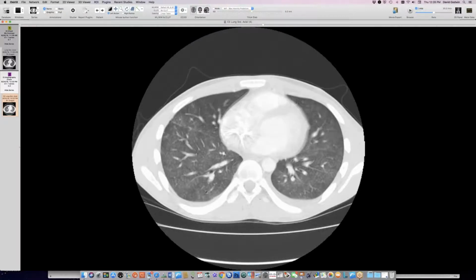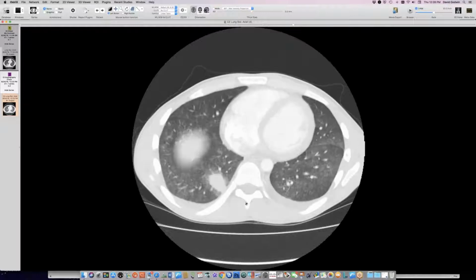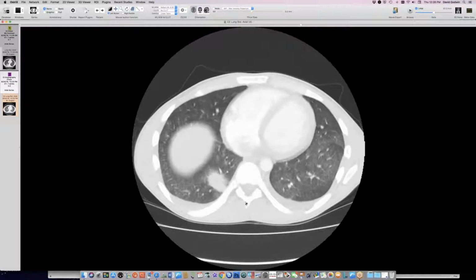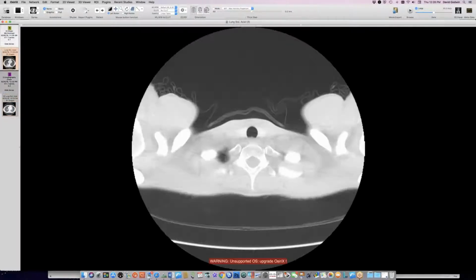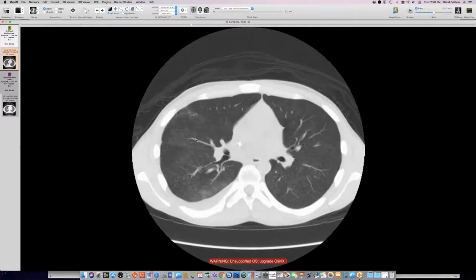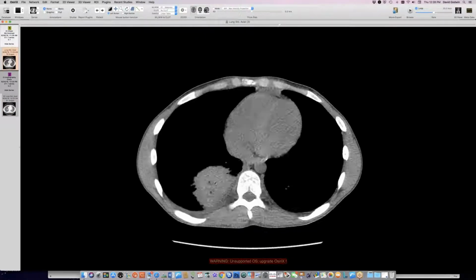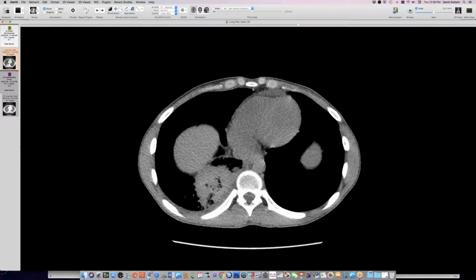It seems to be sort of centrilobular little dots here. In the right setting, this could be hypersensitivity pneumonitis, a bad case of that. But in this setting, it's probably something else. It's probably an infection. And then he has this lesion here in the right base. And then just a few days later, that was the 24th, here is the 29th, 5 days later, you see that this lesion is much bigger. And it looks as if it may be developing a cavitary center.